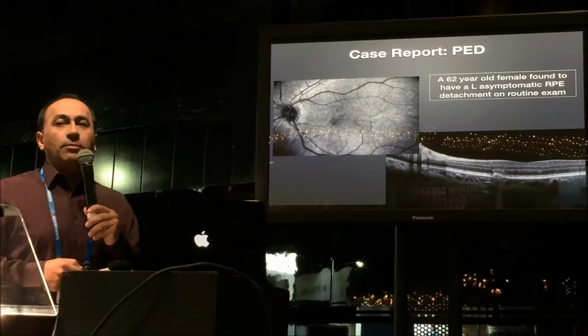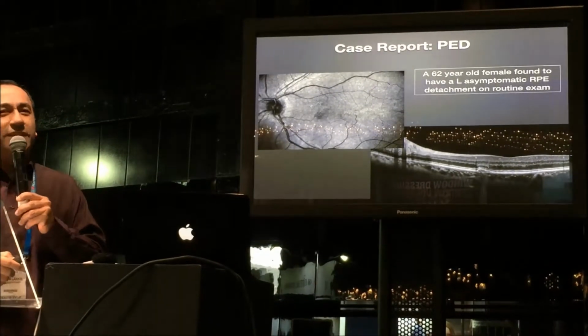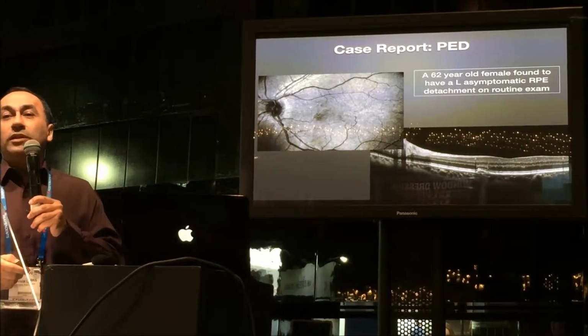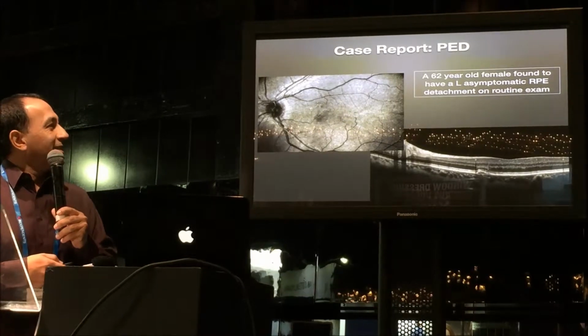In this case, we've just got the little PED, and I'm quite comfortable to follow that. And if it does start to spread closer to fixation, or we start to see the choroidal neovascular membrane expanding, then we can refer her for some treatments.